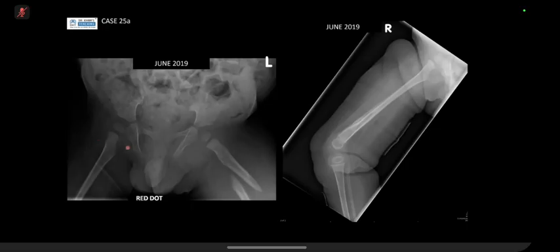I just wonder whether it's due to his position or whether this could be some sort of heterotopic ossification from some of the treatment. But the metaphysis is clean, your epiphysis is clean. I think the diaphysis is probably a bit projectional because you can see he's not quite centered, he's a bit rotated. He has periosteal reaction on the right side, and it's confirmed on the long leg views. And on the left side, yes, it's probably a more chronic fracture with periosteal reaction and signs of healing.